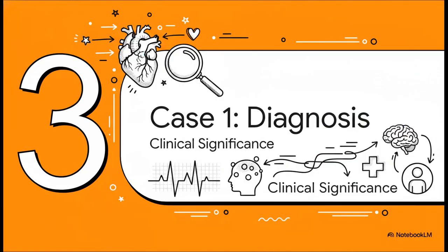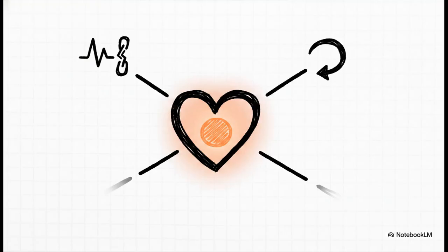So we've dissected the entire elegant mechanism. Now let's put it all together into a final diagnosis and, maybe most importantly, talk about what this actually means for the patient. The primary diagnosis here is accelerated junctional rhythm. It is absolutely critical to understand this. Everything else we saw, the AV dissociation, the retrograde Wenckebach, the echo beats, all of those things are just fascinating downstream electrophysiological consequences of this single underlying rhythm.